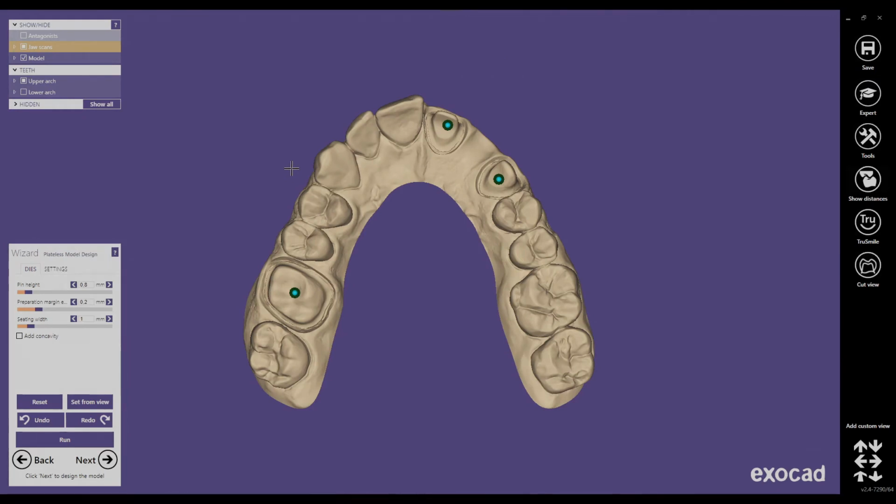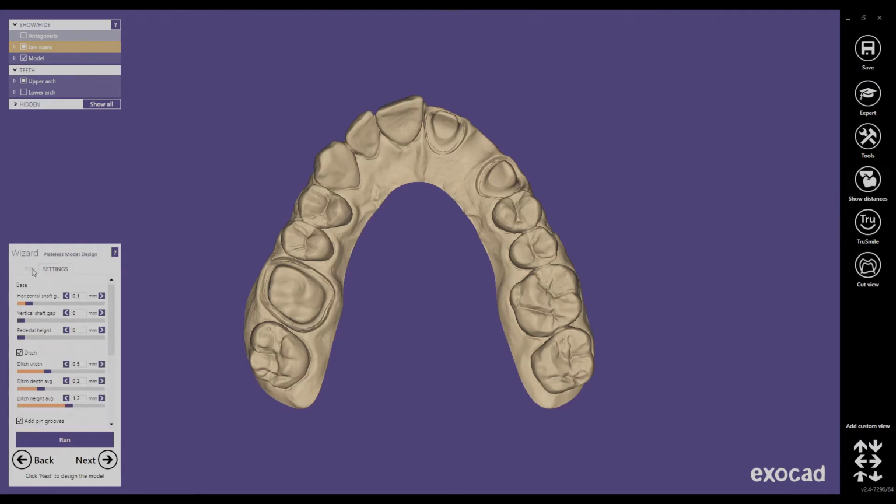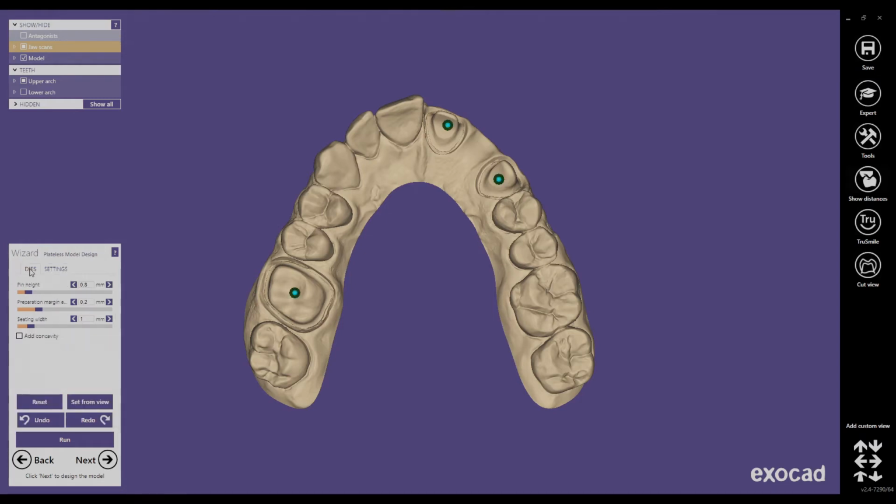If you are reaching this step, you will see our settings ready that you have imported by selecting the right preset. You don't have to adjust anything here. One thing to know is that by default, when this step is reached, all the insertion lines will be perpendicular to the model base.